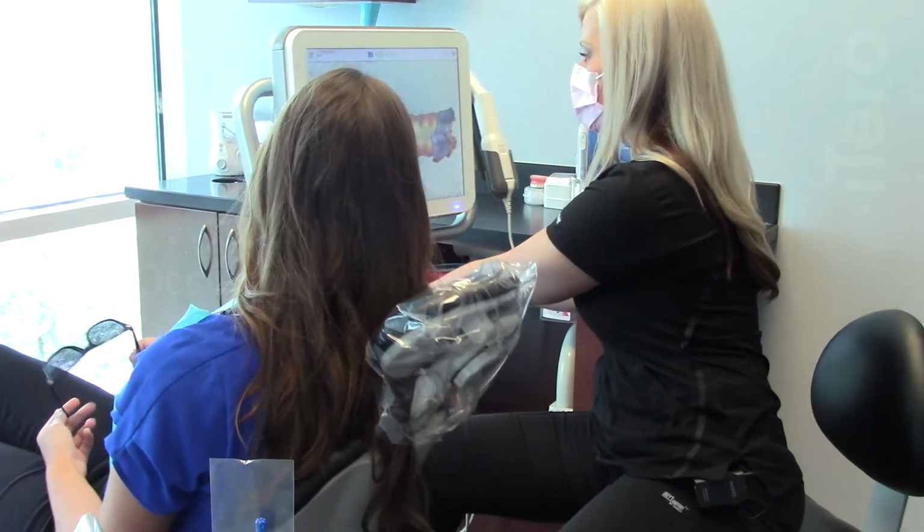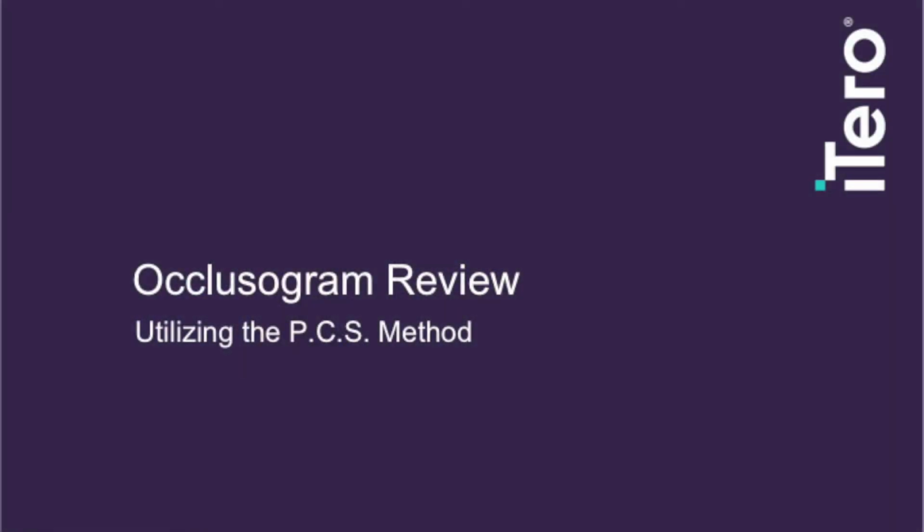at your digital models. Once the hygiene appointment has concluded, the hygienist should run an occlusogram and discuss any concerns by utilizing the PCS method.